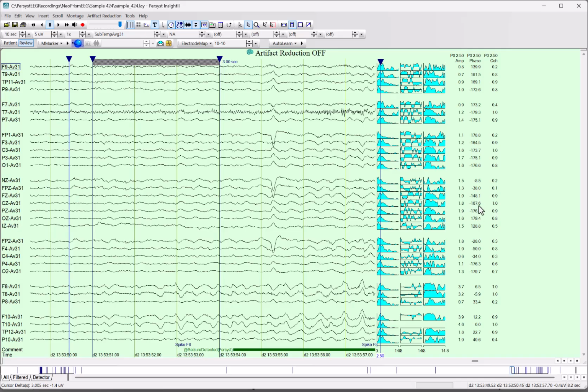So we can have some high values of coherence, but here we can see 167 degrees, 0.6 degrees out of phase, minus 176. If we look here, though, we see this leads slightly, negative 5.9, and that's the amplitude at that frequency. So amplitude, phase, coherence. Let's add another one.